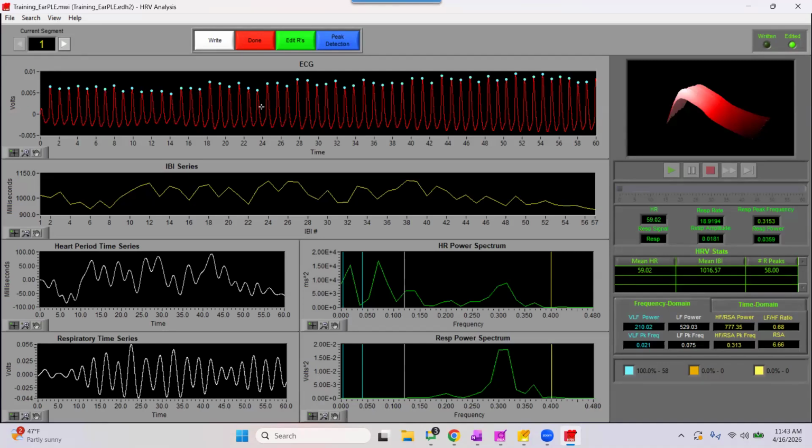We've got very well-defined systolic intervals, nice point precision, and all of our peaks are identified here. So I'm going to take a scroll through the data and see what other types of artifacts we will notice within this given waveform and how to correct them as we are introduced to them.